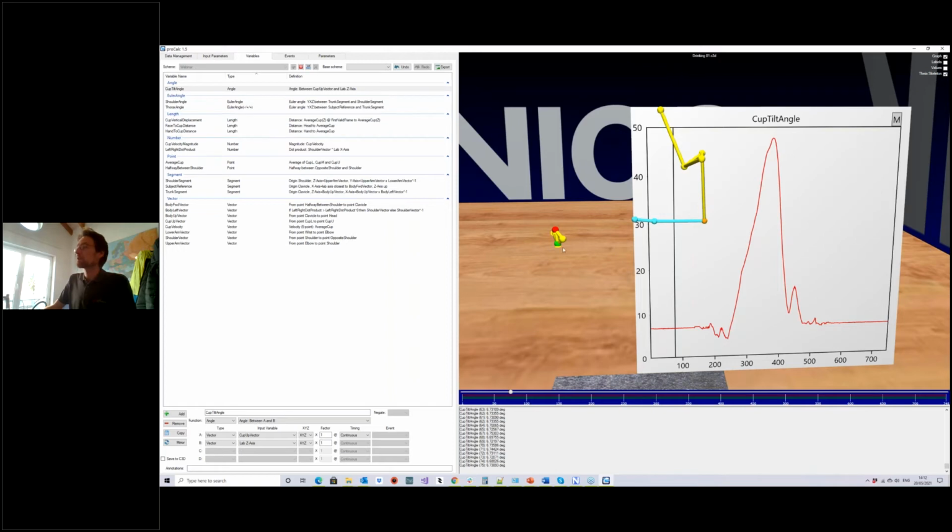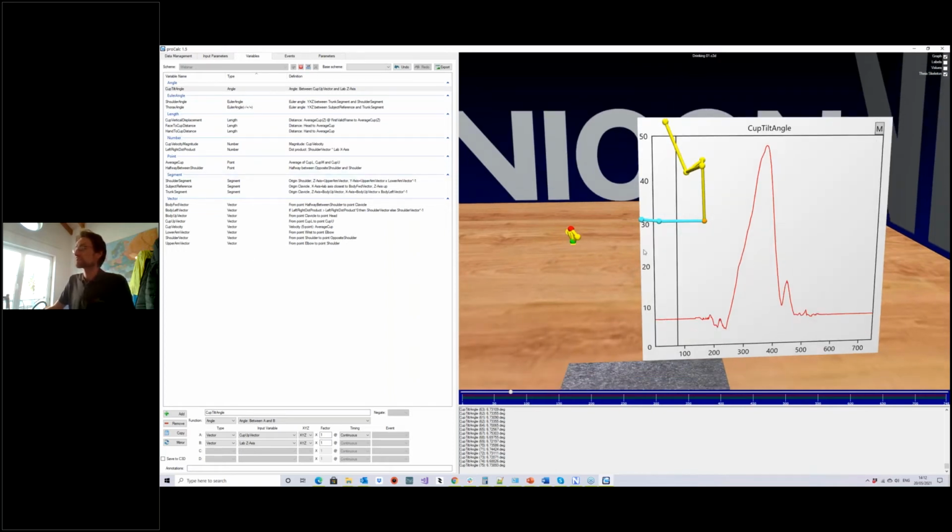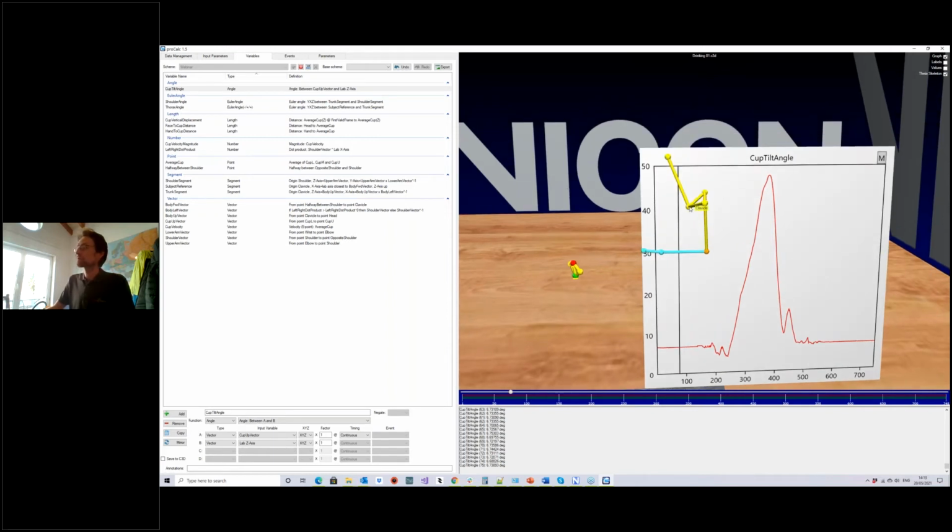The final thing I want to have a look at later is actually the trunk, or how far forward the subject is leaning as the subject then grabs the cup and drinks. Now I could calculate the distance of the clavicle marker from its initial position to its current position, just like we did for the cup's vertical.